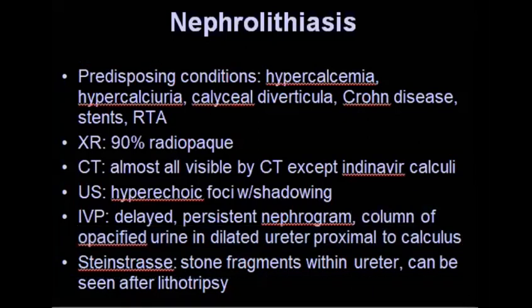Okay, this is the easy one. Then this is much easier. Everyone at least saw it one time. When you have a radio-opaque stone, it is in the urinary bladder probably. So it is a bladder calculus.